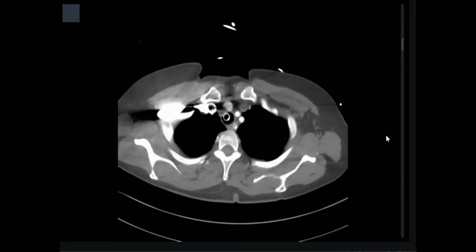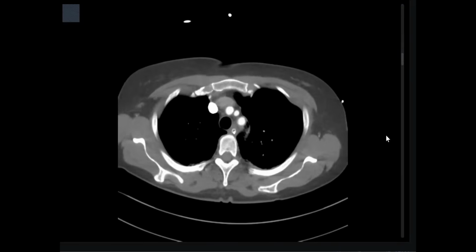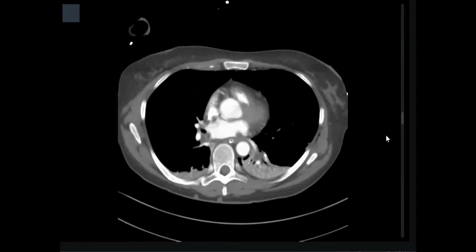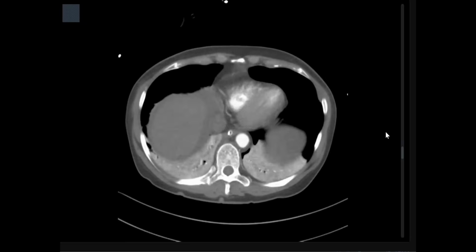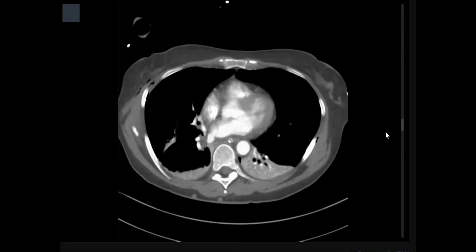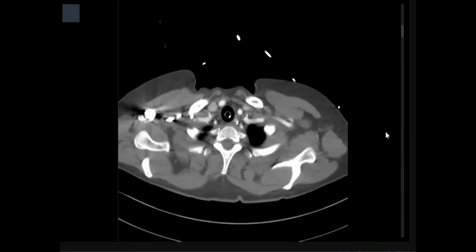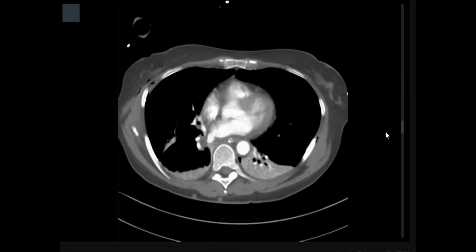There is also an ETT tube in situ, in the tracheal tube, and the tip is well above the carina and the bifurcation of the bronchi. There are several abnormalities bilaterally. I can see that there is collapsed segments of lungs, but I would like to examine this further on a lung window. On the soft tissue window, I can't see any pneumomediastinum or pneumopericardium or hemopericardium.